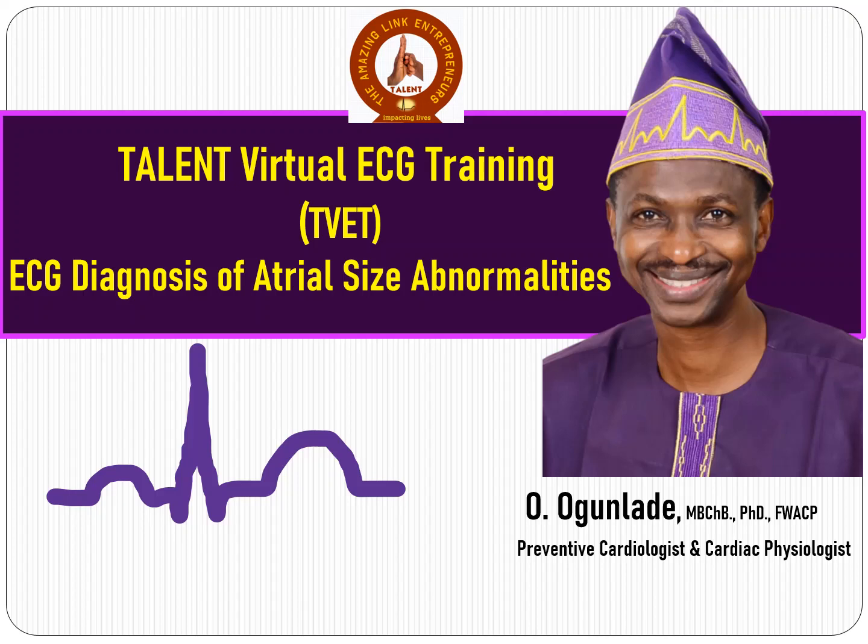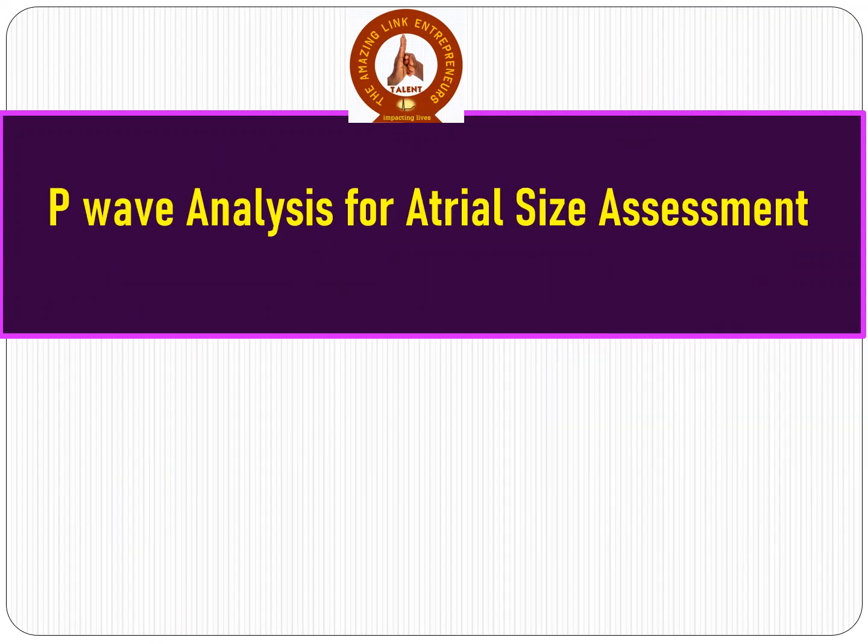The reason for this is that the P wave represents the wave of atrial depolarization. So, in this lecture we shall be dealing in detail with P wave analysis. And in analyzing P waves, all the leads are considered, but special attention is given to leads 2 and V1.